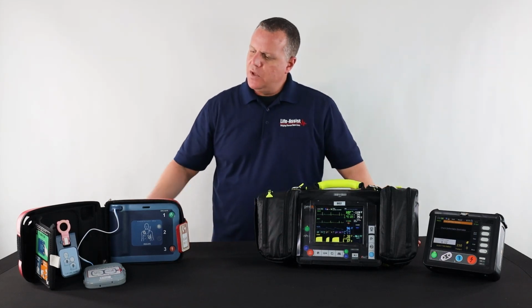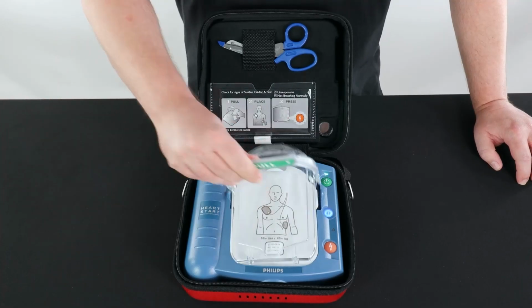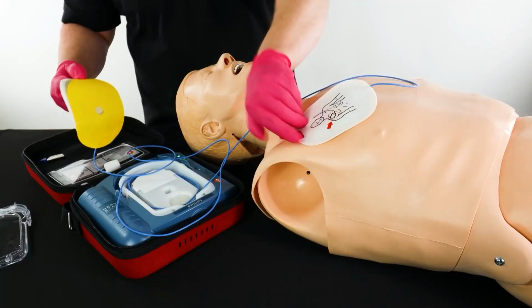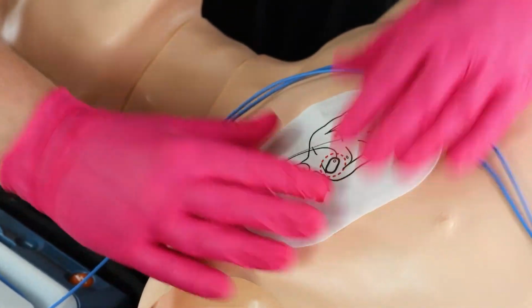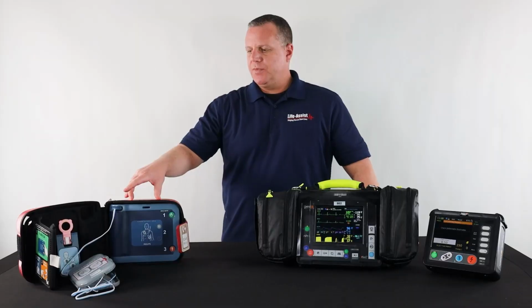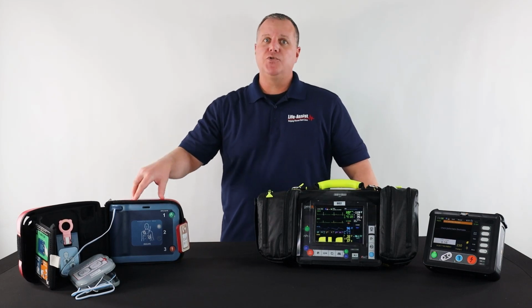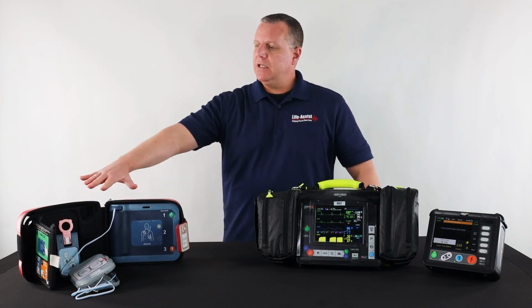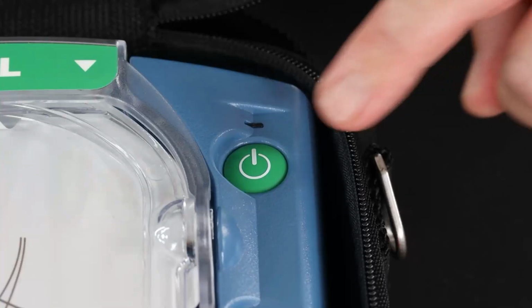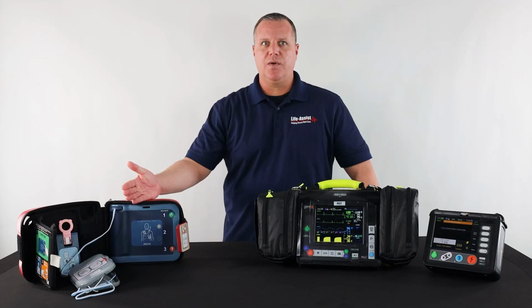Basically, very, very simple. When you power it on and you place what are called defibrillation pads onto the patient, the computer inside will analyze what's going on in their heart rhythm at the time, okay? And if this computer determines that the patient needs a shock, it'll go ahead with voice prompts and prompt you to go ahead and shock the patient. So literally, analytically, the person who's using this doesn't need to do anything. All they need to do is hit power, put the pads on, and listen to what the AED tells you. That's how simple it is, okay?